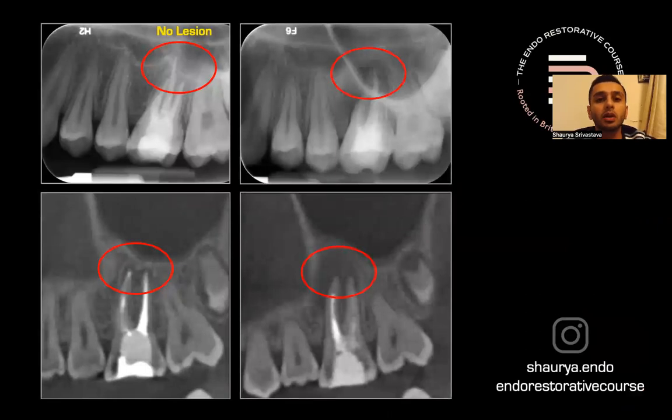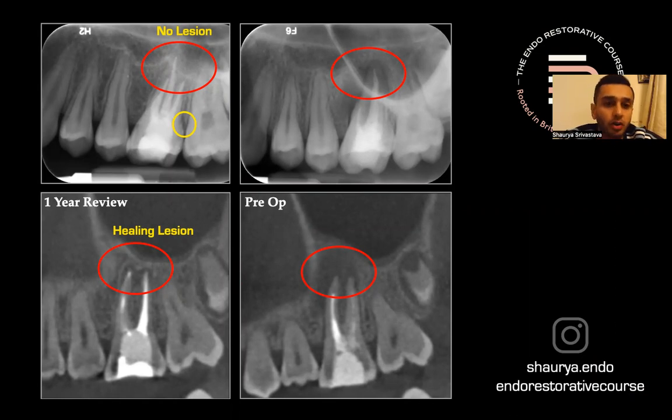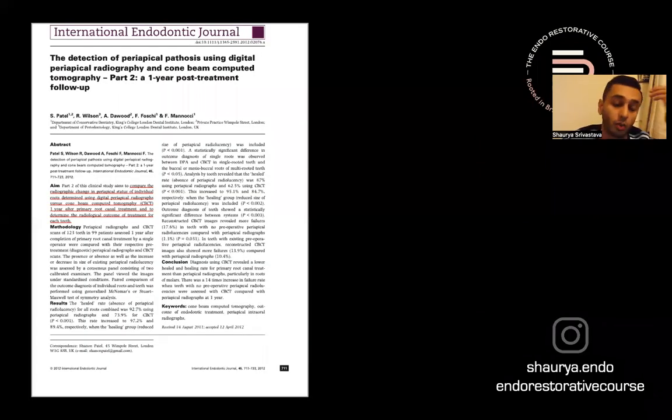So if we look here, that yellow spot over there, the patient has some amount of probing with bleeding as well. So this tooth was basically perio in its sense, not extensive, but it just needed some debridement. You can see some widening of that space over there. She had food packing, there was a probing depth over there, immediate bleeding on probing as well, and a lot of dullness and pain and tenderness when we probed around that area. So again, no intervention required, just a good deep root surface debridement, and the patient would be well on the way and not come back for a while.